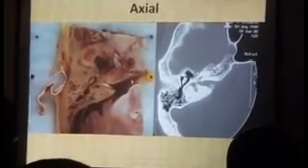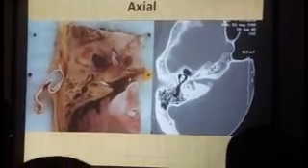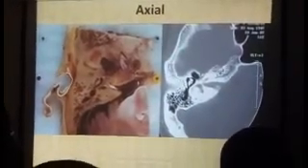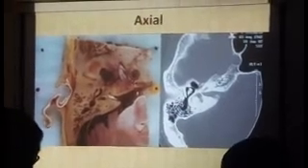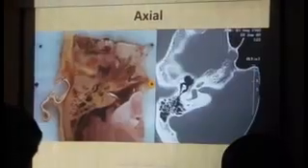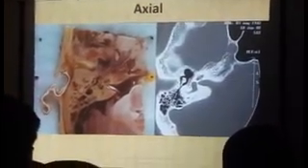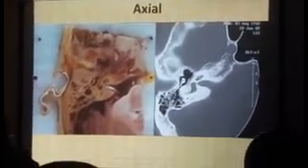That's the labyrinthine segment of the facial nerve, and so this is your geniculate ganglion. Why is it important to identify? Because as you go lower down, you will find that this area is replaced by another structure, which if you look at it in isolation, will give you the wrong notion that it is the tympanic segment of the facial nerve. So right now, in this scan that we were earlier talking about, you can see the entire tympanic segment of the facial nerve.